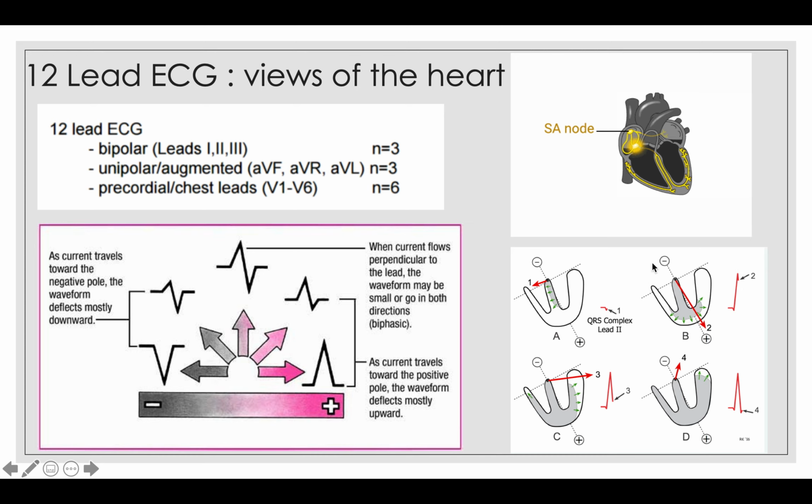Now the impulse, as you can see from the GIF here, travels slowly upwards into the left atrium. Now the left atrium is much more muscular and thicker compared to the right atrium, hence why you have a left positive vector, so the vector is more greatly towards the left side. Again, this is positively deflected, but then on the ECG graph you'll see it coming down. That does not mean a negative deflection.